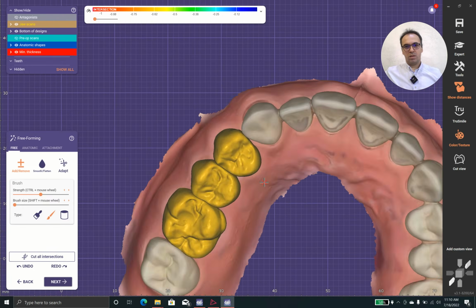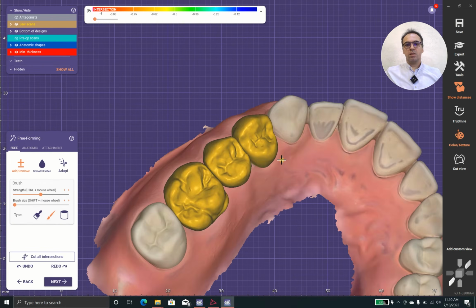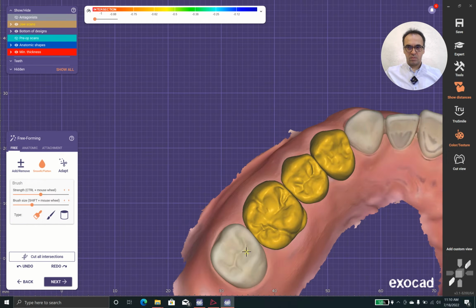And now this is a little bit better. Of course, it's not comparable to the first result, but it's almost good. Okay.